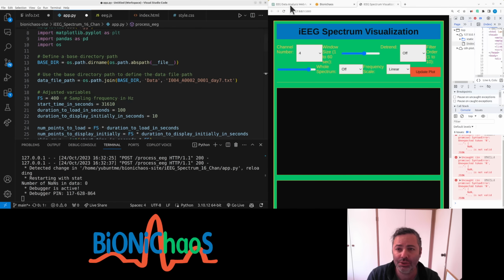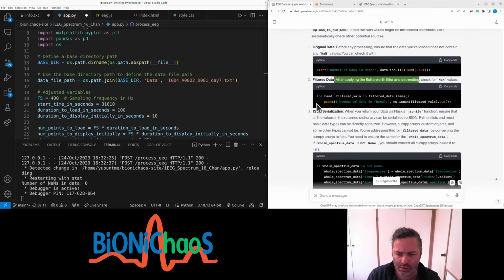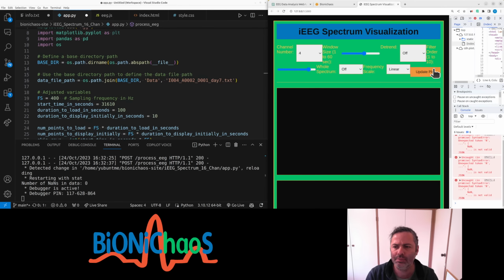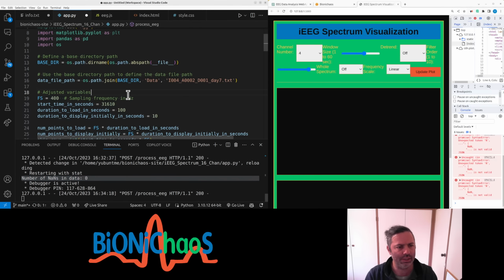Okay, so I have this code. Let's start a new chat because this one is getting tangled in. We supposedly have some NaNs somewhere. Number of NaNs in data.